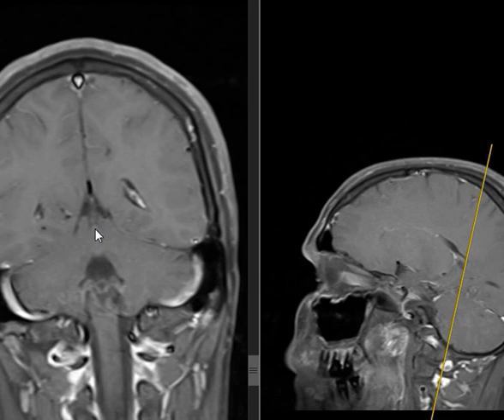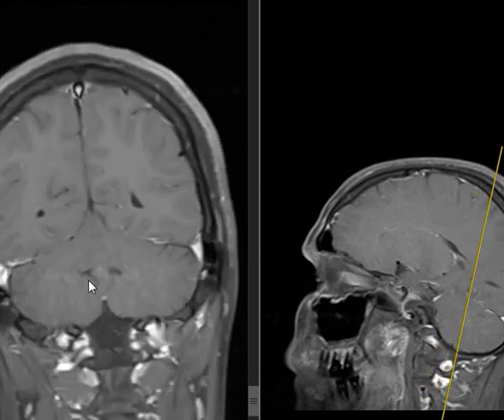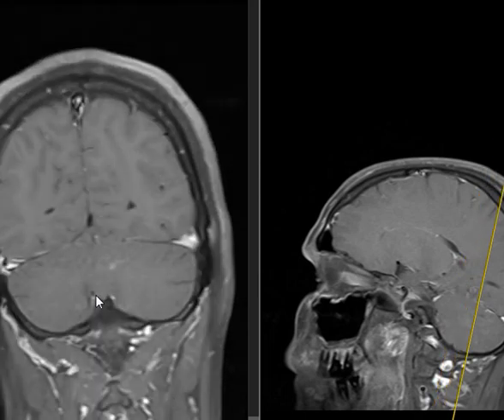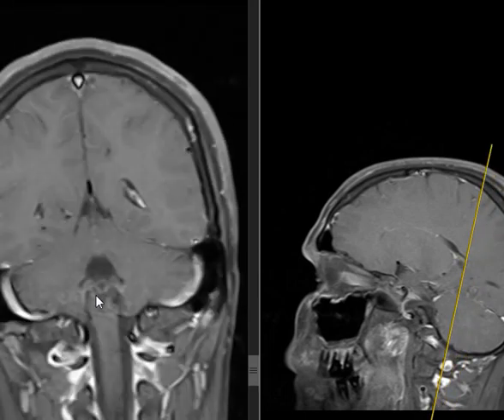First, the cavernous sinus, which basically means the internal carotid artery in the cavernous sinus. And second, where else? That's important to detect if it's encased or invaded or not. A nerve. What nerve? Oculomotor. Optic nerve. Optic chiasm. Yes. These are the major structures that we need to look for any signs of invasion or encasement.